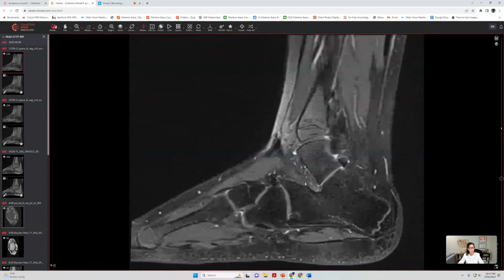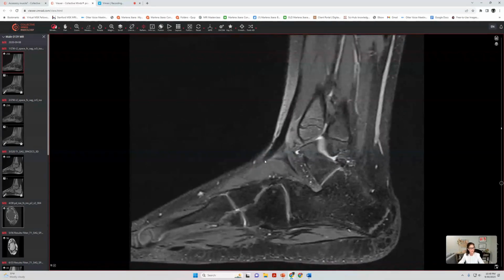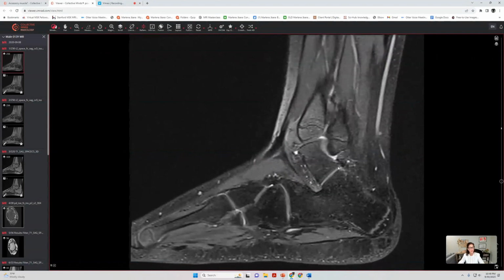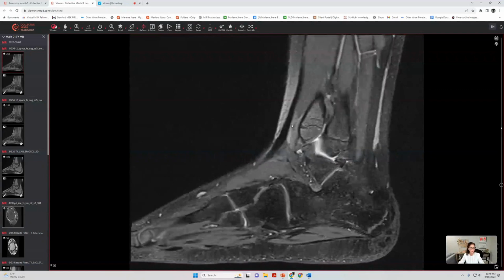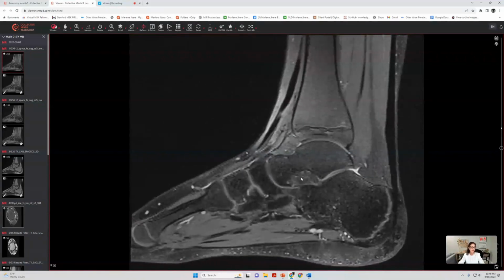That's the pyramid-shaped portion that moves towards the region of the extensor tendons through the level of the extensor retinaculum. So there are connections from inside the articulation towards our extensor tendons that help us with proprioception. So we can see that on a sagittal image.